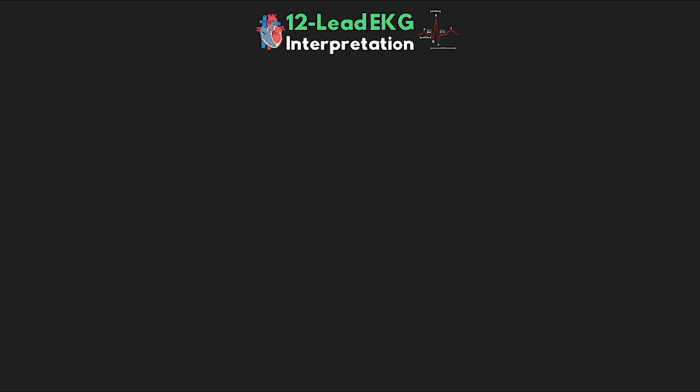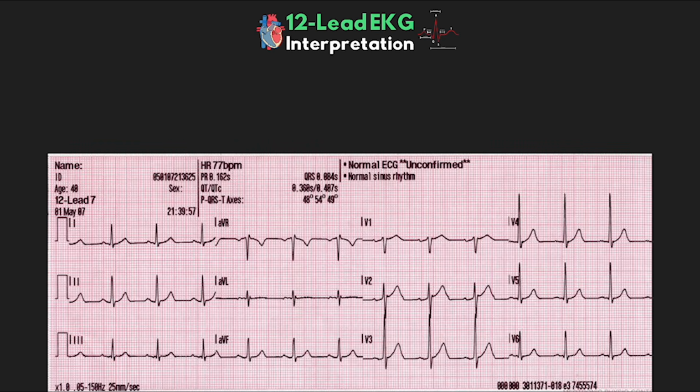Right here is an example of a normal EKG that we're going to primarily use throughout this lesson. It is important that you see normal. Knowing normal is going to help you identify when something isn't normal. And particularly in the ICU, we're seeing sick people, elderly people, and they just aren't completely normal. So it's really helpful to be able to recognize a good normal EKG.